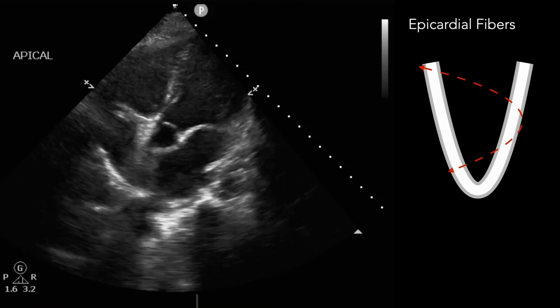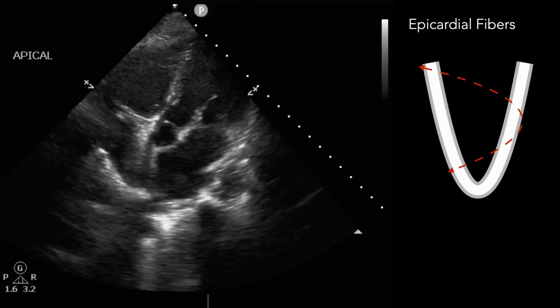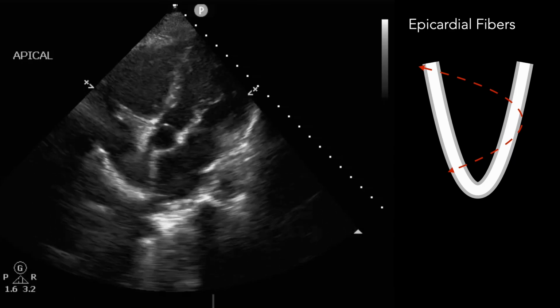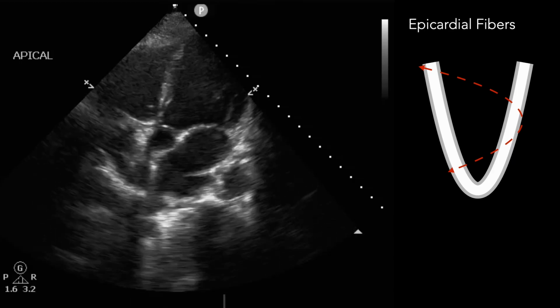And so where this becomes practical, other than just the theoretical, cool, that's great, what do I do with this now, Matt, is that you have a hard time measuring one of these parameters and getting an accurate assessment of what the actual left ventricle function is. And this is really where it gets important with the fractional shortening.